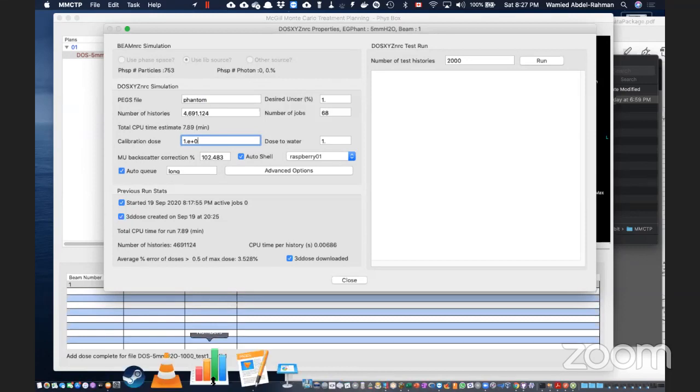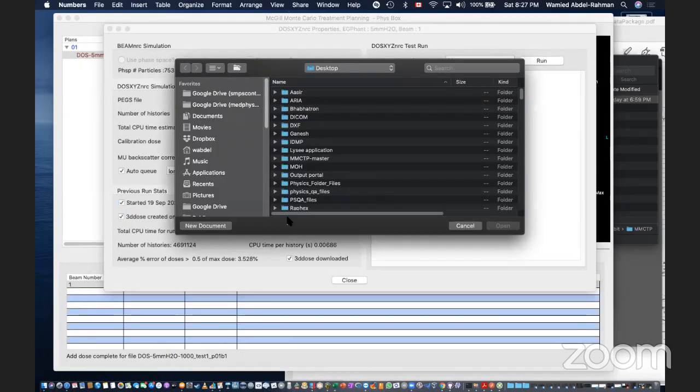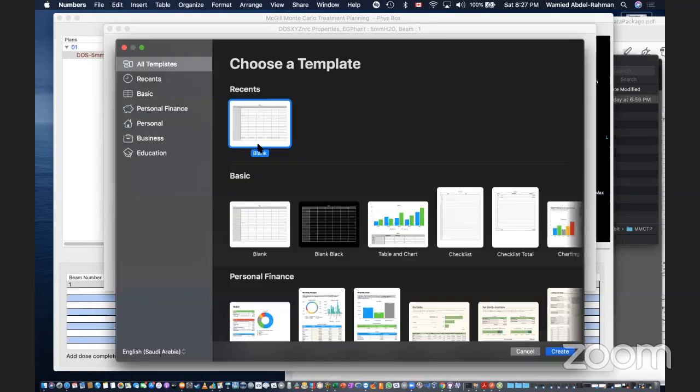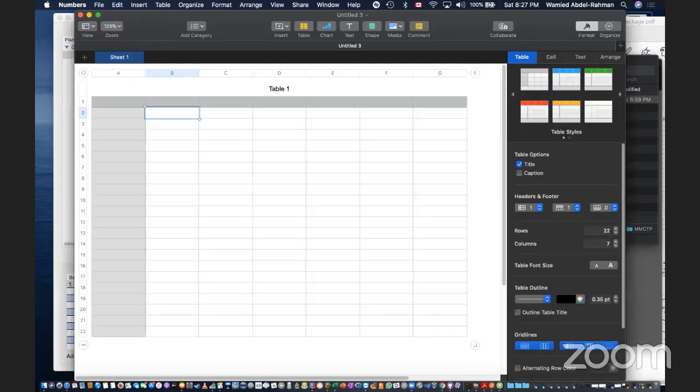Yes. And if you want to assign it permanently for all future calculations, it goes in a settings file. But if you just want to change this calculation, you would do it right there. So 5.95e minus 12.